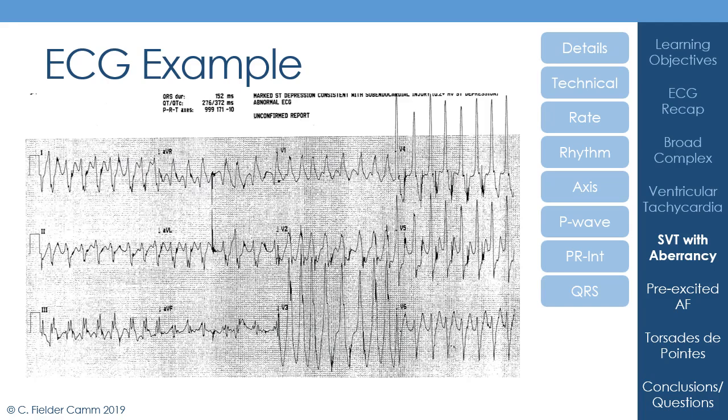I think the other thing to say about the QRS complex here is that they're not consistent. So you see that the heights vary quite a bit, the amplitude of the QRS complexes vary quite substantially, and you can see that quite clearly in V4 in the top right. And also how broad they are varies. And so it's all very weird that the complexes are changing very frequently.